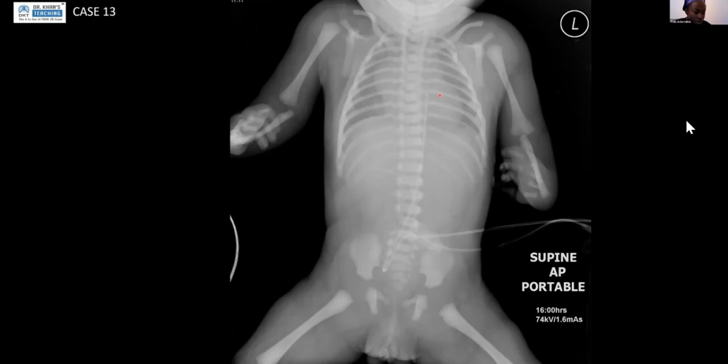R is for renal. All these patients will have renal ultrasounds to assess for any renal abnormalities such as horseshoe kidneys, duplex kidneys, unilateral kidneys, single kidneys, et cetera. And then L is for limb, and as correctly identified, you can see here that the patient is missing both their radial bones bilaterally, and the forearm appears shortened. So this child has limb abnormalities as well, which is what the L in VACTERL stands for.